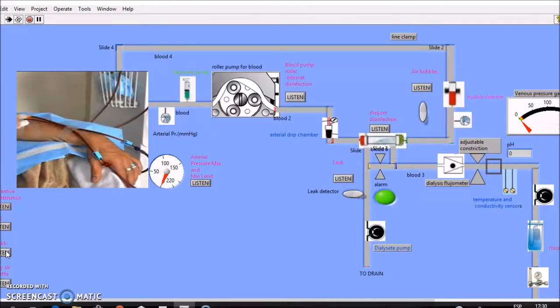Weekly cleaning and disinfection. This is responsible for disinfecting the system by means of a chemical, and it is immediately rinsed with water to clean the extra waste. Cleaning and disinfection of the bicarbonate containers and the suction lid.